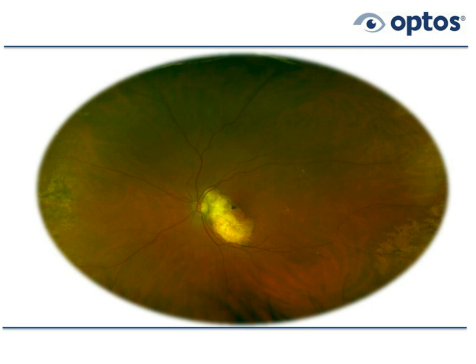Back then, this was a little bit before the anti-VEGF age. One of our retinal specialists decided that the best thing to do here was to treat this patient with laser, and he did. Amazingly, he was able to treat the patient with laser without affecting the fovea, and that's tough to do. The fovea is still uninvolved. The patient's acuity is still 20/20 minus in this left eye, amazingly, and that white lesion is actually a scar, if you will. There are some peripheral lesions, as you can see, also some drusen and pigment and RPE changes in the peripheral retina.